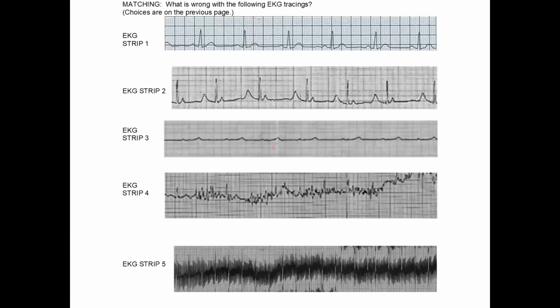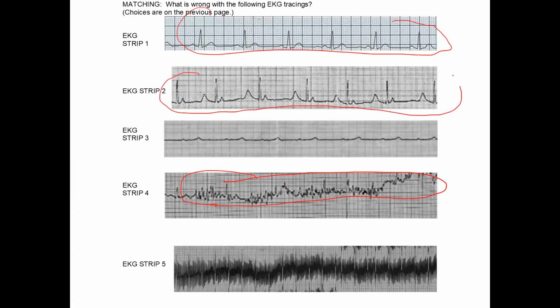Okay, now these are just problems that we might have seen. And the most common is artifact. Like this is a skeletal muscle artifact here. And it's pretty obvious. That's not a pathology. This is normal right here. And this one is backwards, you see? It's like you made a copy for your lab partner and it showed up backwards, like the T is in front of the QRS and the P follows it. That's not, I guess, an artifact, but it's a mistake.